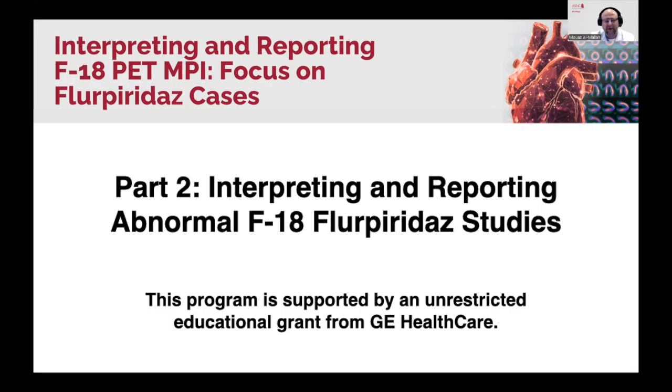In this session, we will review three abnormal cases and discuss issues that need to be considered when reviewing and interpreting these images.